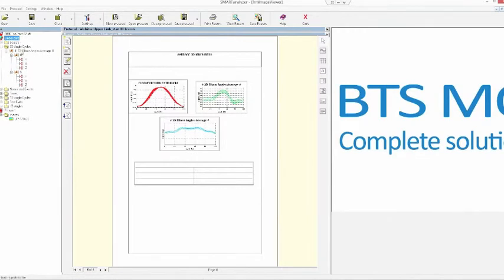So these variables are below the global data. Below time, I have the average cycle time computed, and below 1D angle, I have, for example, the value of the range of motion.